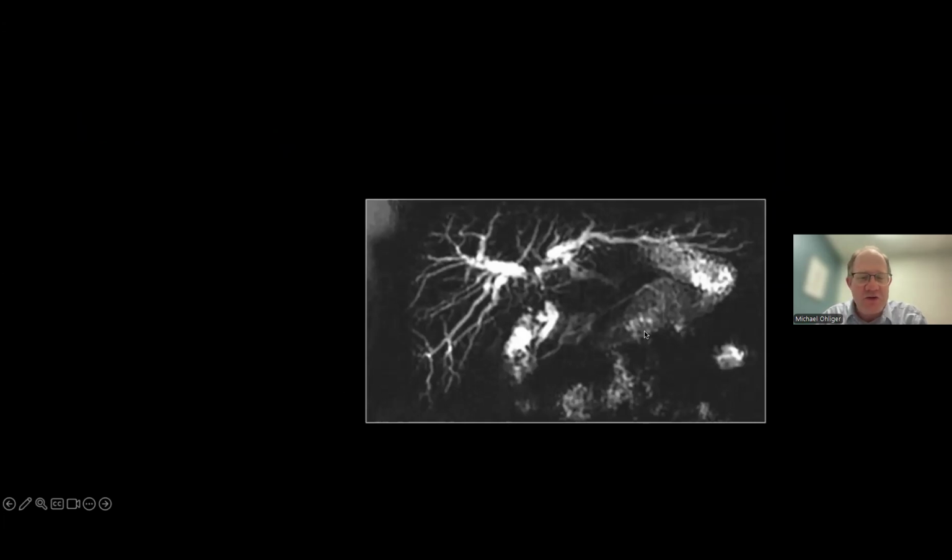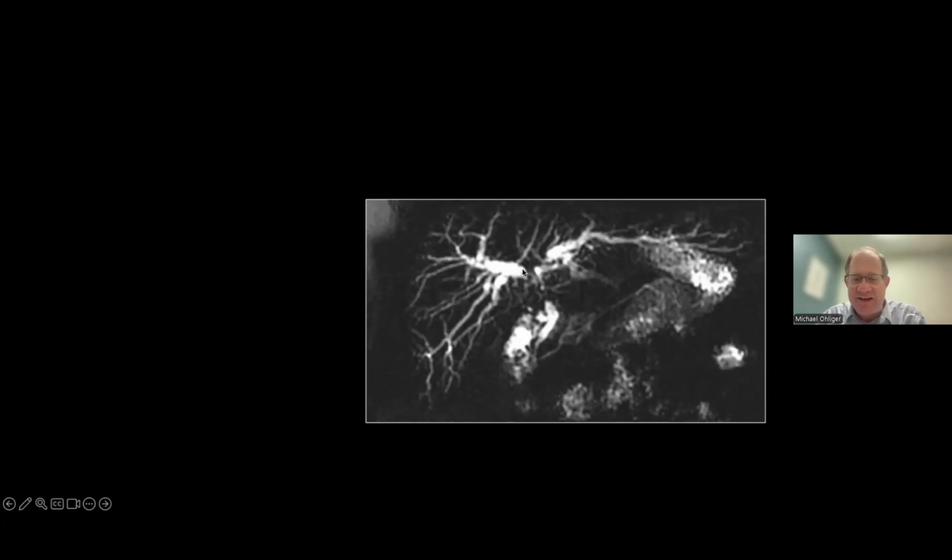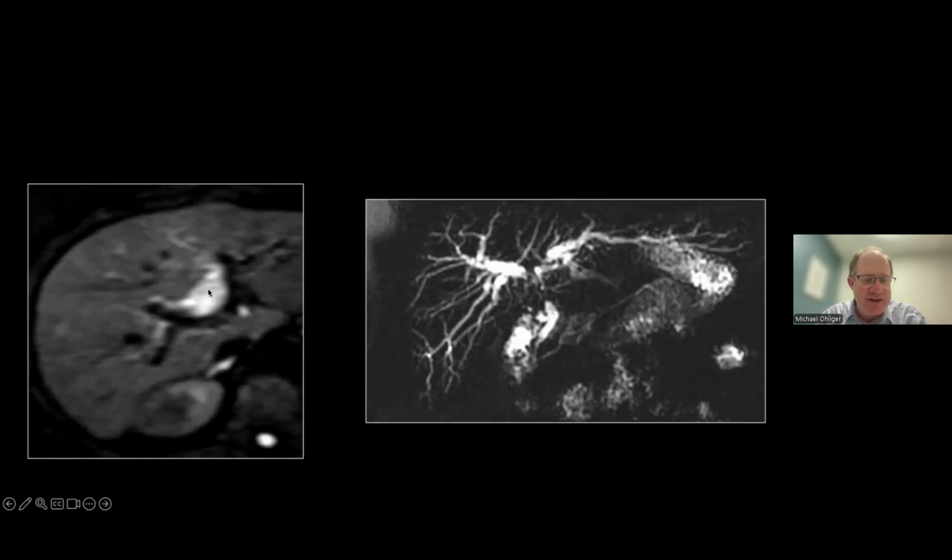One thing I just want to show you as a counterexample is this one, which looks exactly like our Klatskin tumor, right? This is where we had our hilar cholangiocarcinoma, right? Abrupt termination of ducts, nothing there in the middle. And actually, we see the mass here.